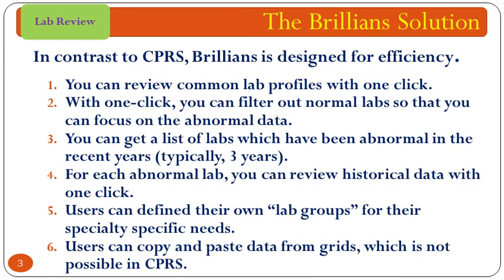So, what is the solution? In contrast to CPRS, Brillians is designed for efficiency. It offers many ways to streamline lab data review. 1. You can review common lab profiles with one click. 2. With one click, you can filter out normal labs so that you can focus on the abnormal data.